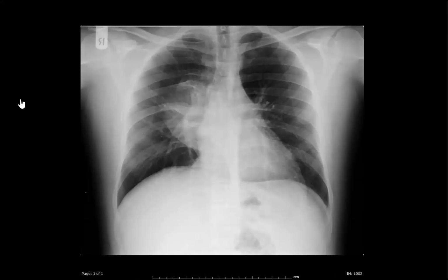So this is a posterior mediastinal mass. The right cardiac border is seen through, and the heart is an anterior structure, so it is not anterior. The hilar vessels are seen through, and the hilar vessel is in the middle mediastinum, so it is not middle. And the definitive sign is splaying of the ribs, widening of the ribs with hyperostosis and remodeling. It's definitely posterior mediastinum. From a radiograph only, we suspect a neurogenic tumor.